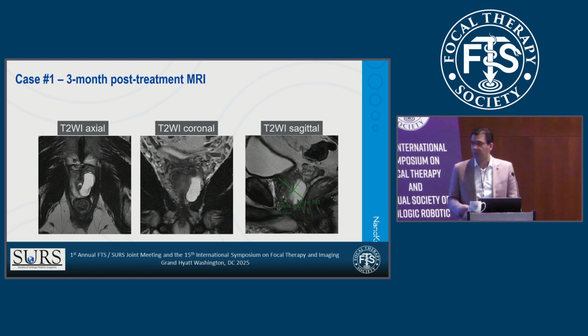Unfortunately, sometimes you have a cavity that's formed. This was actually urine, which does occur. They're looking to change the format for this. But I show this case because this is something that we see often enough, and the challenge is that if you do a biopsy of the area, you don't want to cause an infection during the biopsy because you don't want to have this area infected. To do a biopsy, I usually sample around the outside of the cystic cavity if it's present.